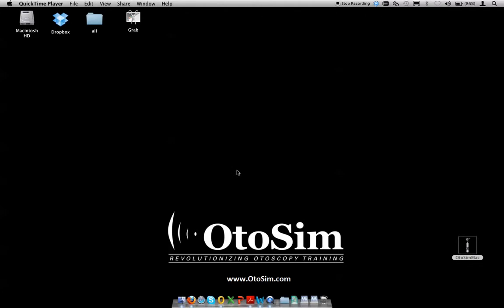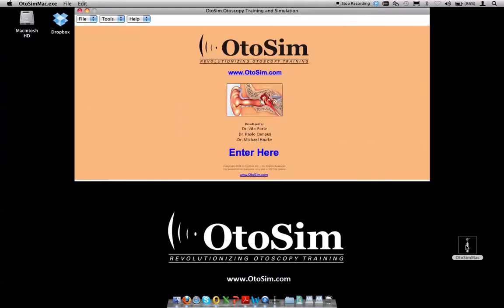Hi, this video is intended to introduce you to the OtoSim 1.2 software and some of the functionality. The screen that you see now is the starting location that one would start on a laptop. After having loaded the software one time, you will have this small icon on your desktop, which by clicking on this icon, you will load up the OtoSim program.